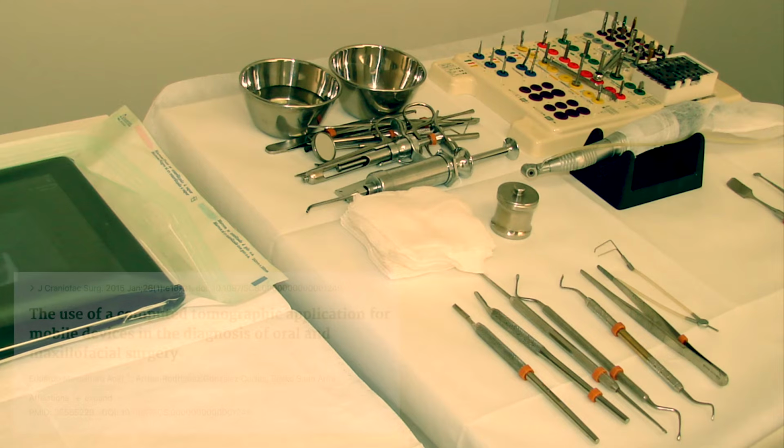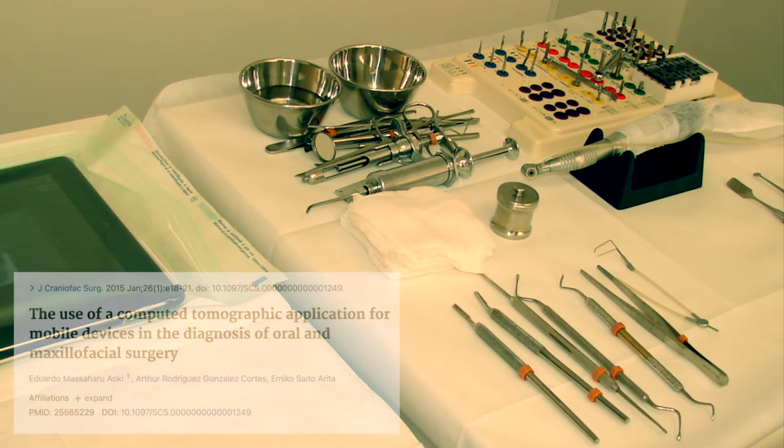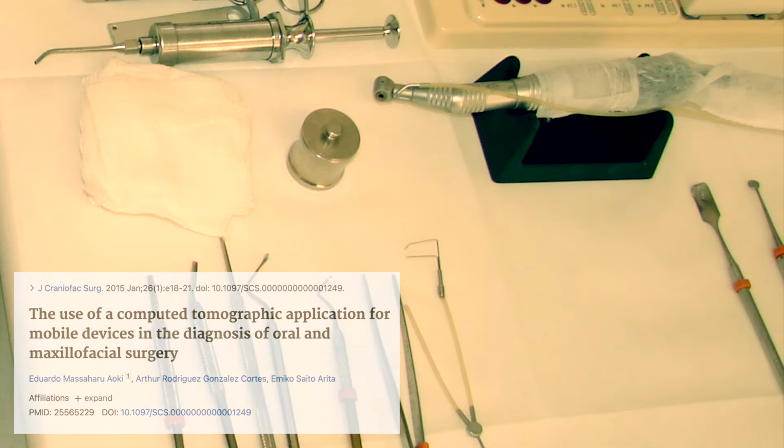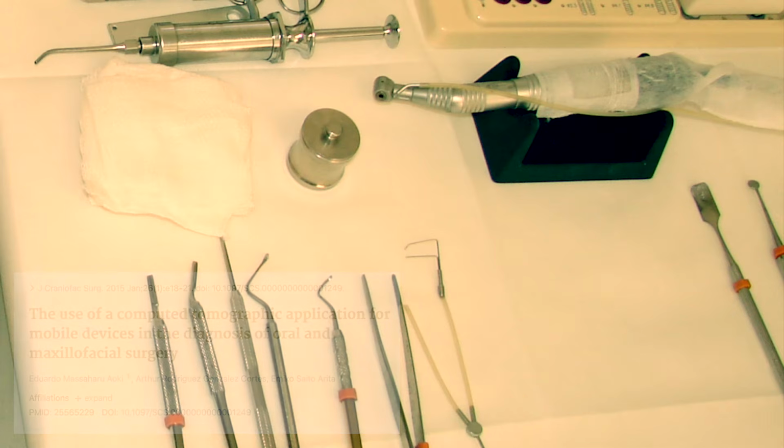So going yet with oral surgery, then we have, of course, a series of instruments to open your flap, right? So this is my surgical table before a dental implant. There is even my iPad, and there is a recommended reference for you guys where I'm talking about this. And we have here even the containers for saline solution. We have the implant kit from top to bottom, right? So then we have the motor now, because you need to use the motor. This syringe on the top is for saline solution with pressure, and that's amazing.